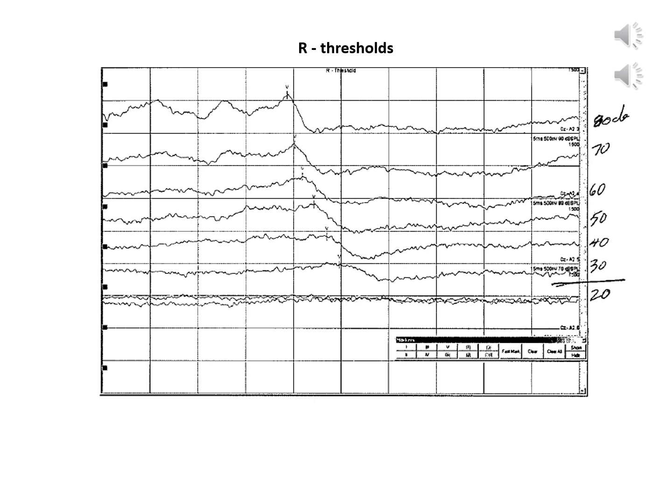And so in summary, this hearing threshold on the right ear is consistent with the brainstem auditory evoked potential recordings that we just saw for this patient, where the recordings on the right ear looked better than they did on the left ear. And so we see that reflected in the thresholds, where the hearing threshold on the right ear is down to 30, which is close to normal, and on the left ear it was a much higher threshold. And so the interpretation for this patient is a hearing deficit on the left ear.